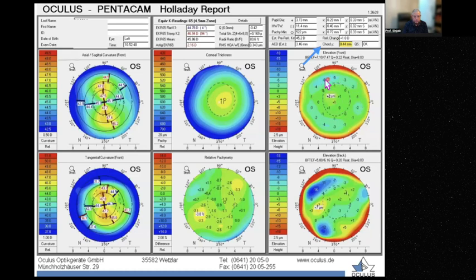We look at any number within the central 5 millimeter zone. You can go to the settings here, click, and it will show you if you wish to choose the 5 millimeter circle. So the 5 millimeter circle will be displayed here. So you look at any number within it.